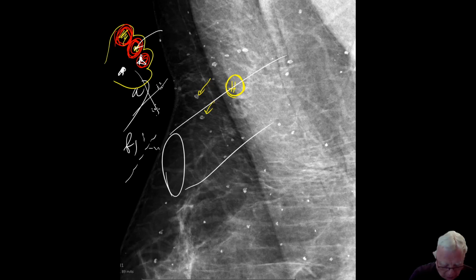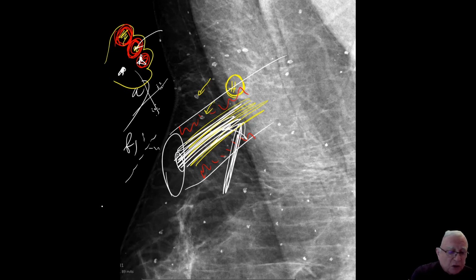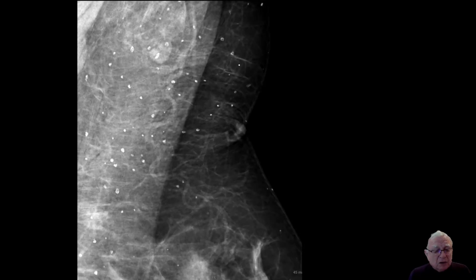Likewise, the carcinoma is growing in the duct, micropapillary solid. That's a central necrosis. And within that central necrosis, there is the malignant type calcification. So it's within the hole. If there is a hole and the calcification surrounds it, that's not a malignant type calcification. So here we have another skin calcification, very extensive.